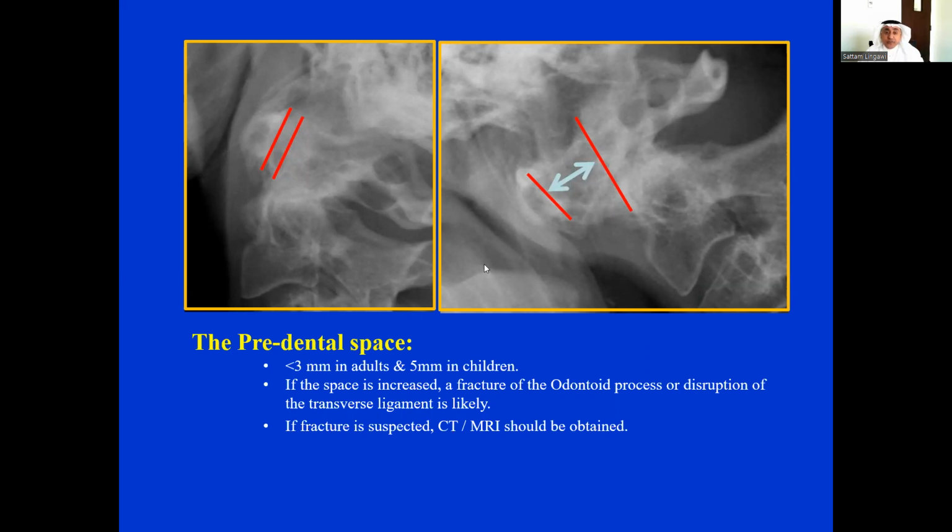This is very important and could be life-threatening. It is an unstable injury and should be further evaluated with CT scan.